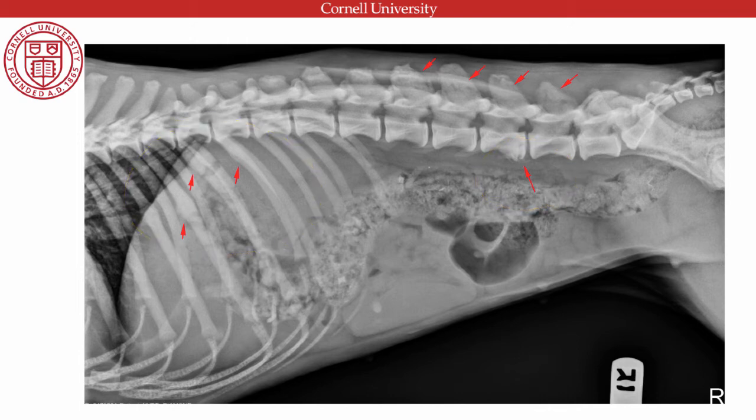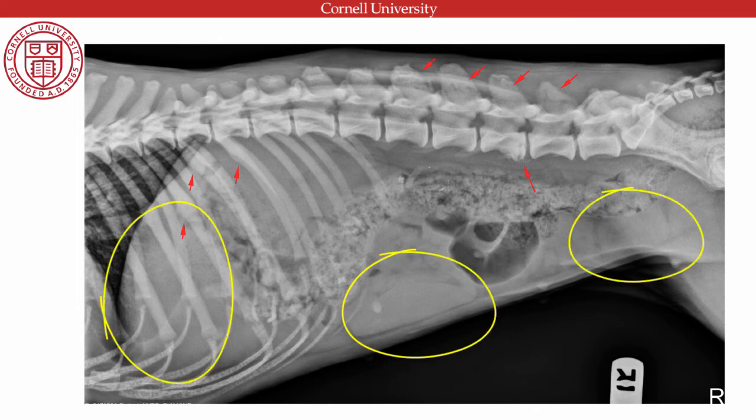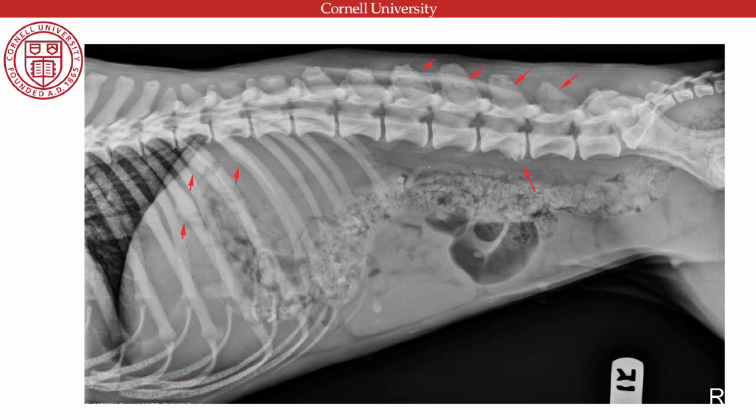Serosal detail is normal, which is great. She's a bit thin, and we can still see roughly spleen at this level, urinary bladder here, liver coming down, a nice image of gastric axis. That's all appropriate. Splenic head, kidneys. So I can see her organs nicely. She clearly has eaten, but she doesn't have much in her stomach at this stage.